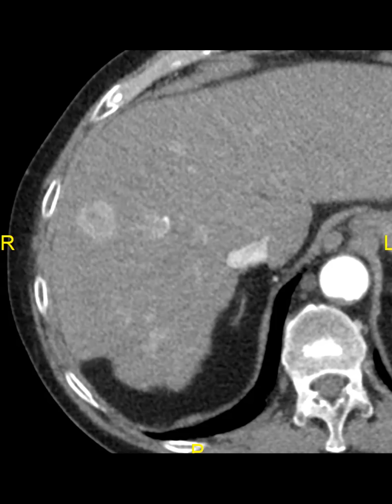And finally, for hepatobiliary phase, because the central core is fibrous and fibrous tissue picks up any contrast, not just EOVIST, you will have a central core which is slightly hyperintense to the periphery on hepatobiliary phase.